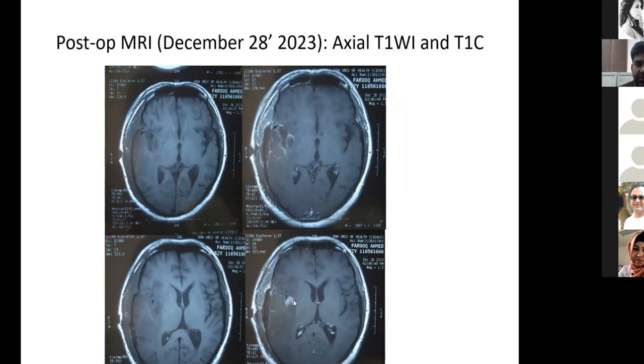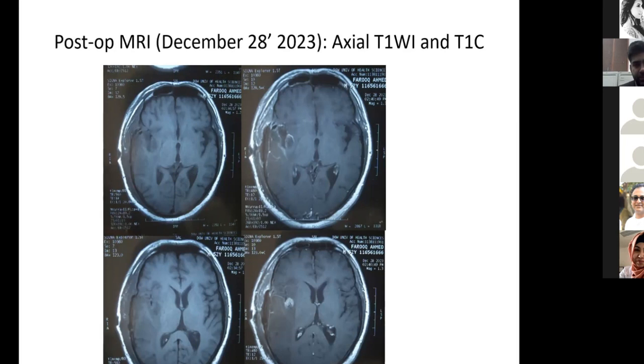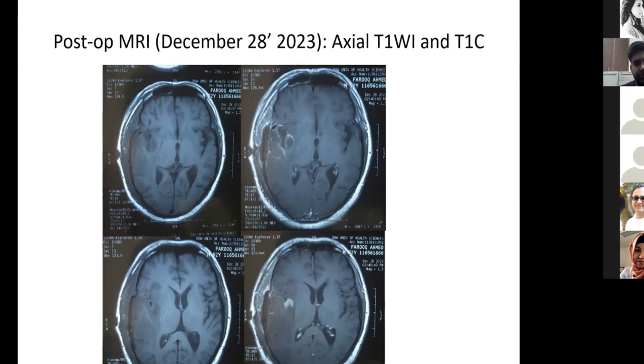This one you mean? Yes. Okay. Because it is following the same area which was of the tube. Since we have seen the pre-op images, the medial wall was extending in this region. So it is probably a small residual to me. But obviously we will follow this patient radiologically.